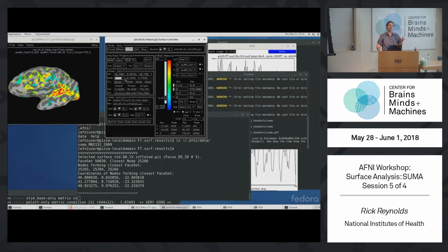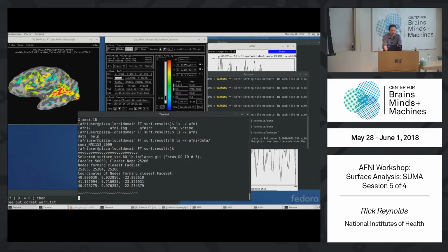So what if you wanted to put in your publications, well, where am I in MNI space? Fine, I can do a group analysis with this data, but the coordinates don't mean anything. I want the coordinates to mean something. Well, remember, for this analysis, what is important? What is the part that gives us the group correspondence? The STD.60, the map icosahedron with the resampling of 60.